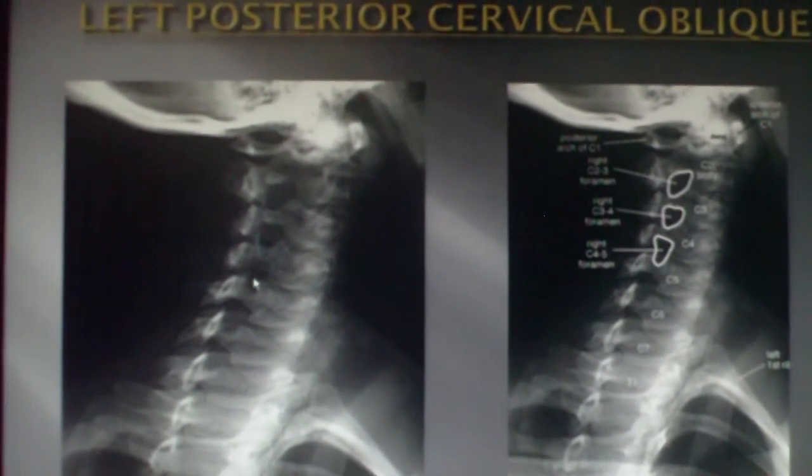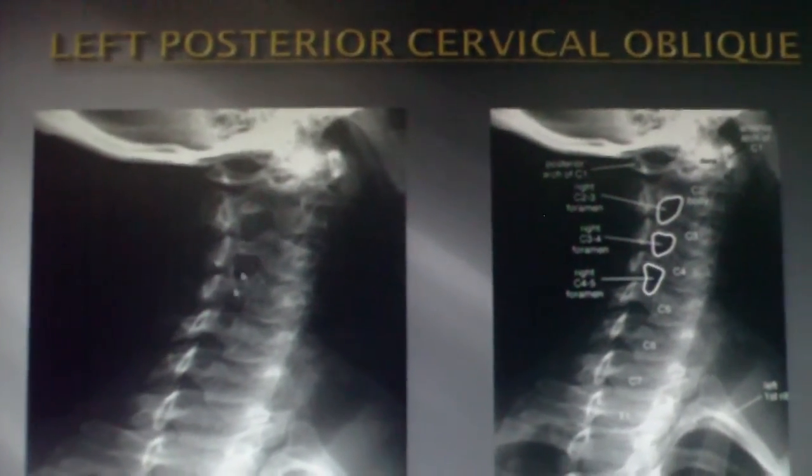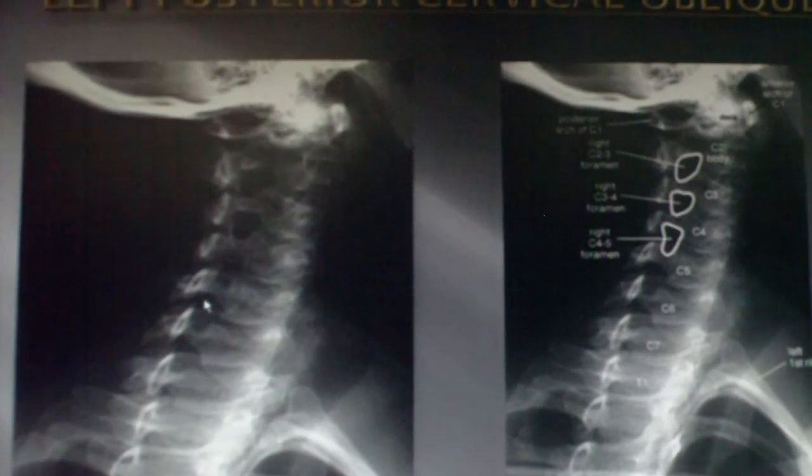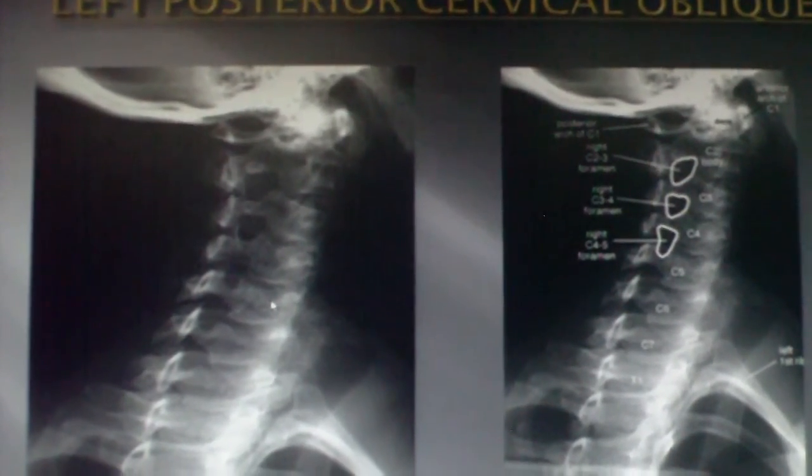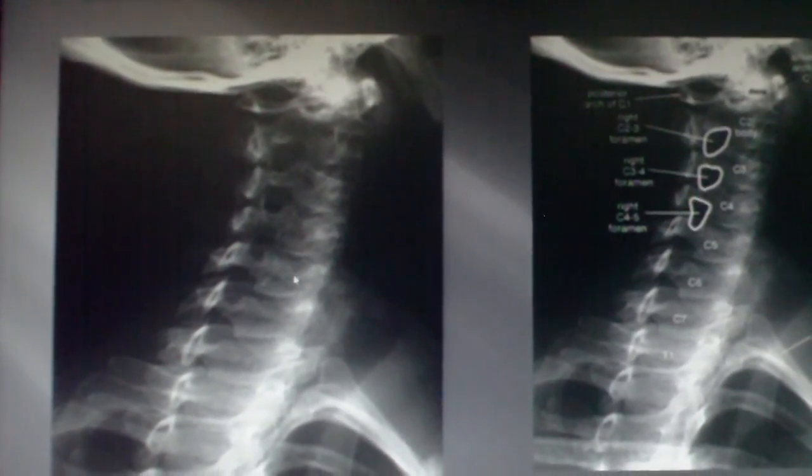So then just identify the IVF. Everything around the IVF has to be right stuff, and then everything in front of the IVF, for the most part, is going to be left stuff.